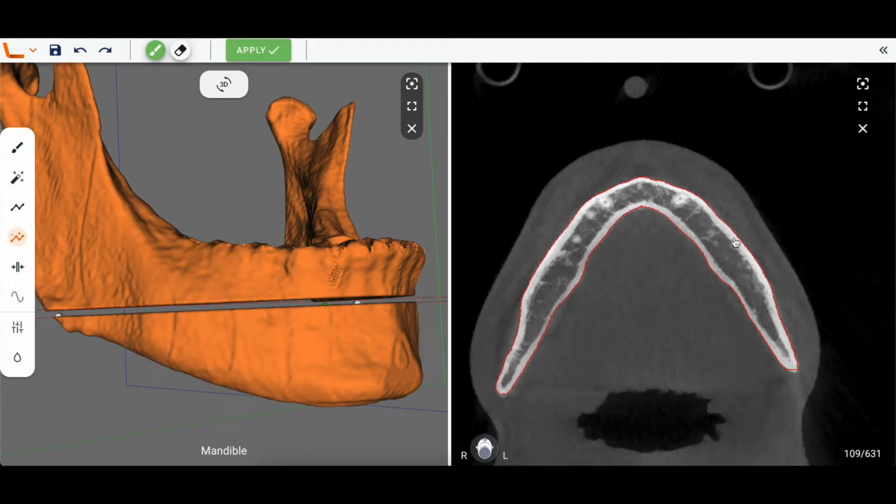We can click here and also place a fourth point on the contour, even though in this particular example, it doesn't seem necessary. When I'm happy and I want to make sure that the segmentation gets closed, I can press the Enter key or the spacebar in order to close the contour.